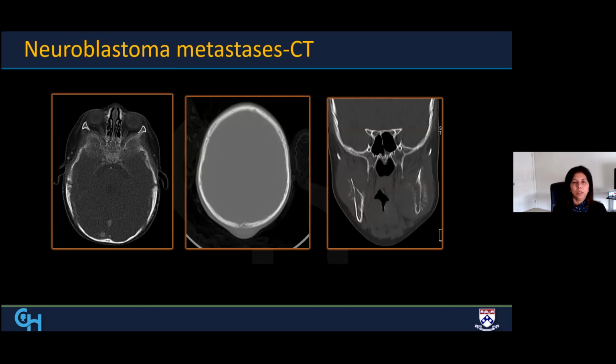And you can see here, these are images of different patients from the CT scans, and the very spiculated appearance and bulky lesions are usually the hallmark of neuroblastoma metastasis. They love the region around the orbit and the craniofacial regions. Even the calvarium is very typical, when you see a permeative pattern, or you can see the sunburst pattern associated with these bulky metastases.